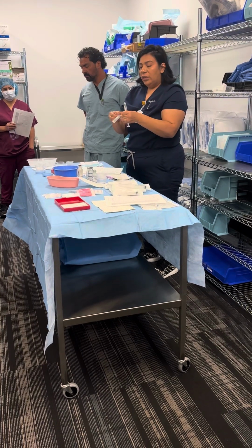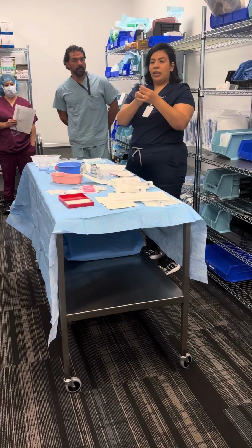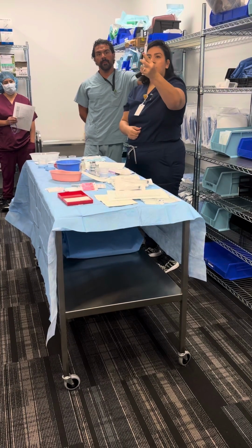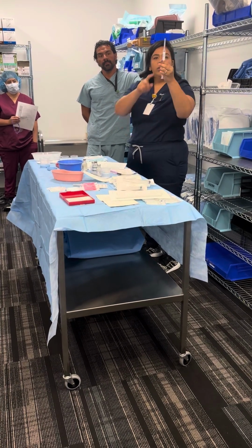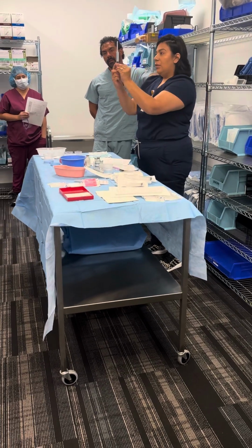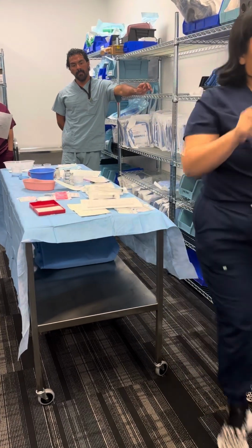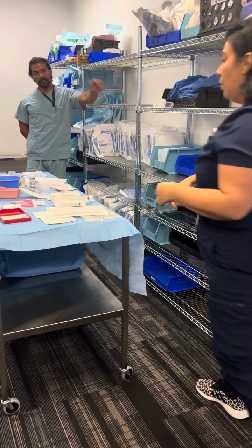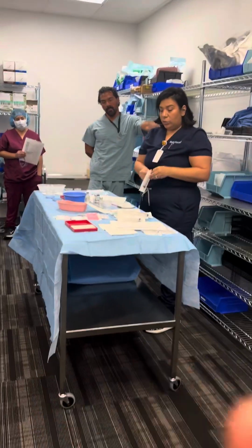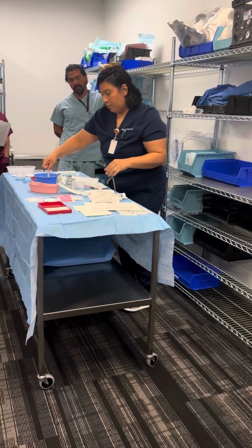So you don't really need to be precise and take all the bubbles out, but just make sure you don't have a huge bubble like that. You know, just kind of shoot it up to where a little bit comes out. Make sure it's at 10. So if you pass this around, you'll see that it's right at the 10. Okay? You're gonna make sure it's at the 10. I am then going to inject, so just pretend that this is labeled already, okay?